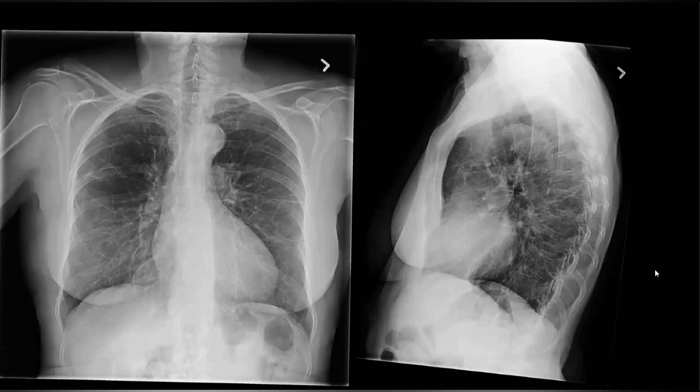I remember it is associated with some autoimmune disorder like Sjogren syndrome, so you have to inquire about that. But what do you think about the zonal predominance of LIP? I can't really recall it properly. It's lower.